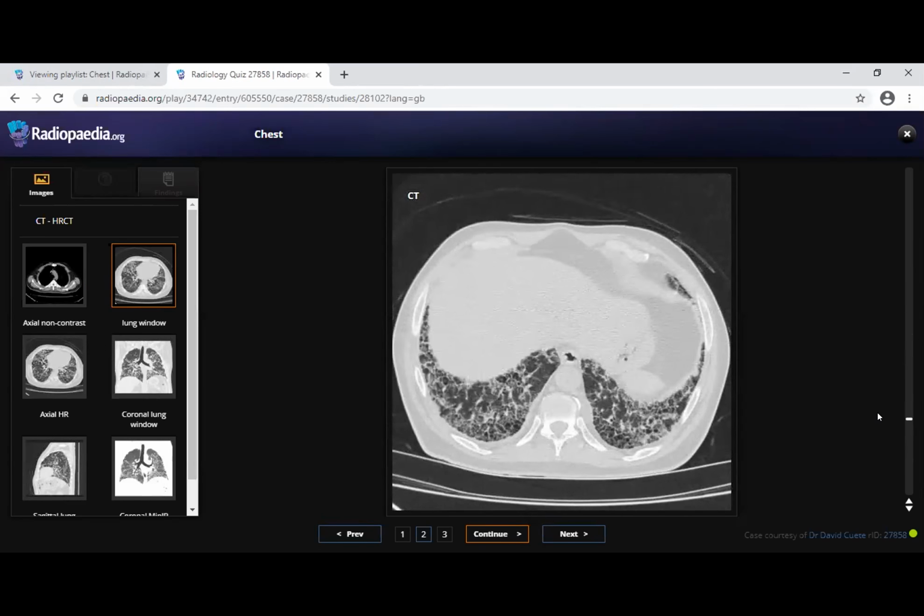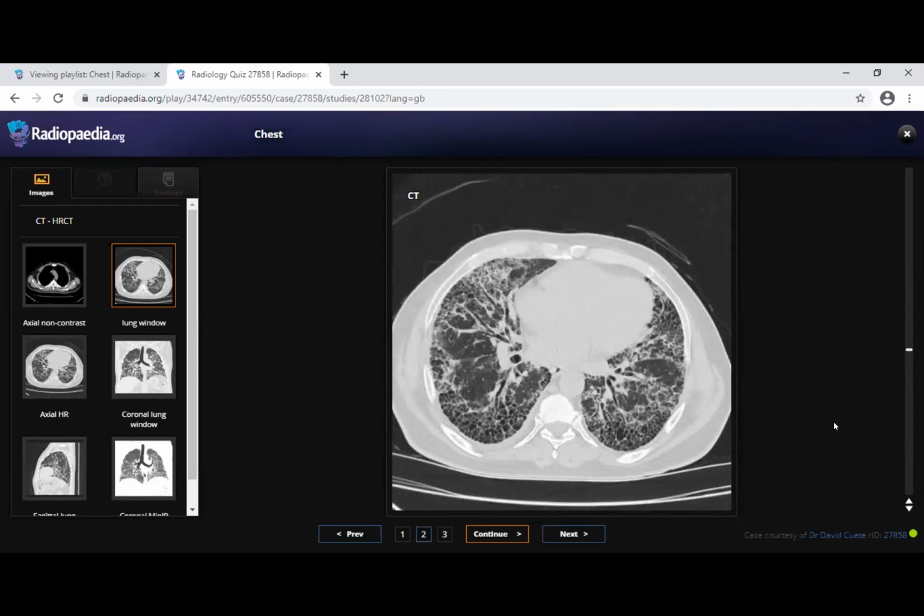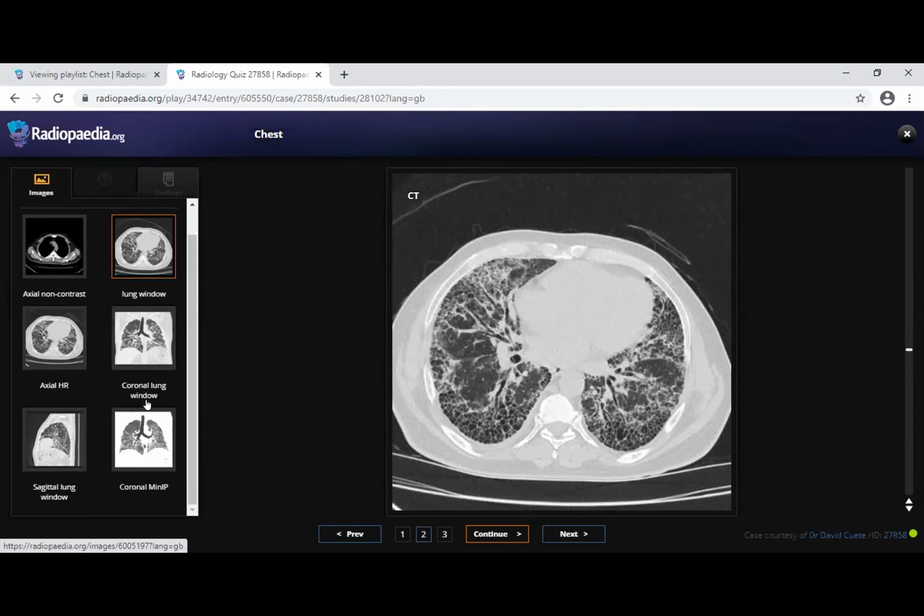So in summary, interstitial lung fibrosis with more affection of the lower lung lobes. In view of the dilated esophagus, my top differential diagnosis is scleroderma. However, differential diagnosis could be idiopathic pulmonary fibrosis versus rheumatoid versus asbestosis, which is less likely as there is no evidence of calcified pleural plaque. So my top diagnosis is scleroderma.